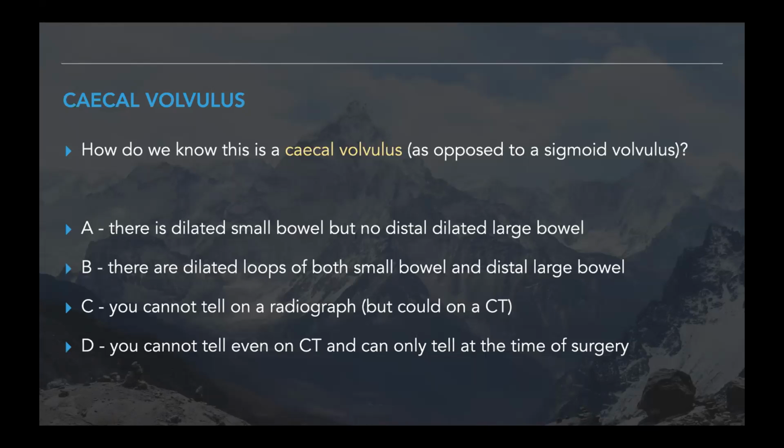So think about where the obstruction is with caecal volvulus and what the radiographic consequences of that might be. Okay, whenever you're ready.